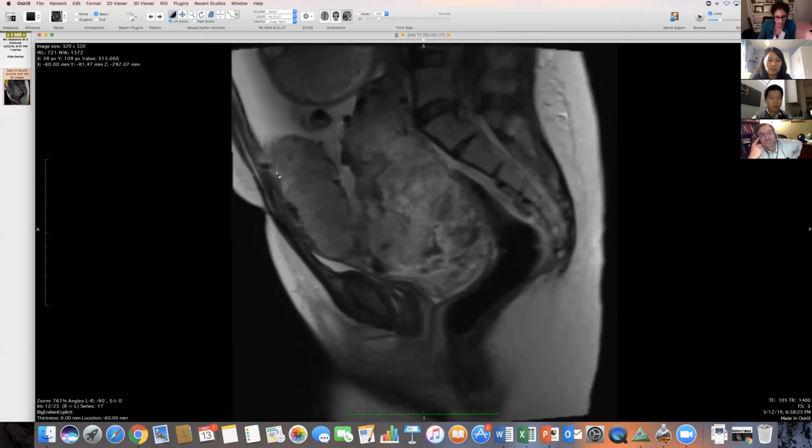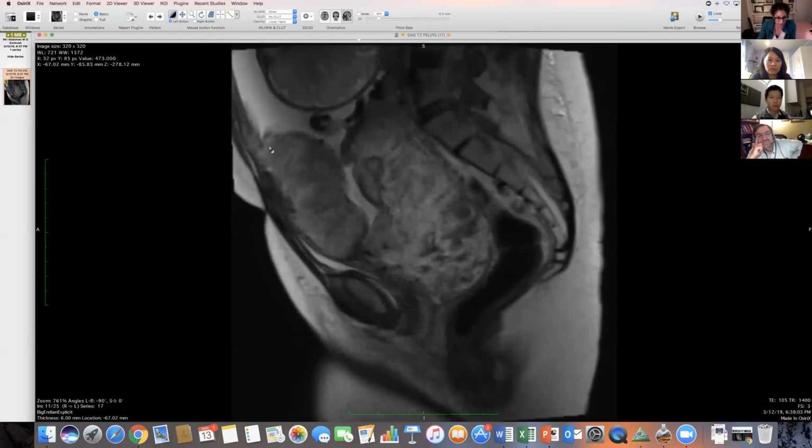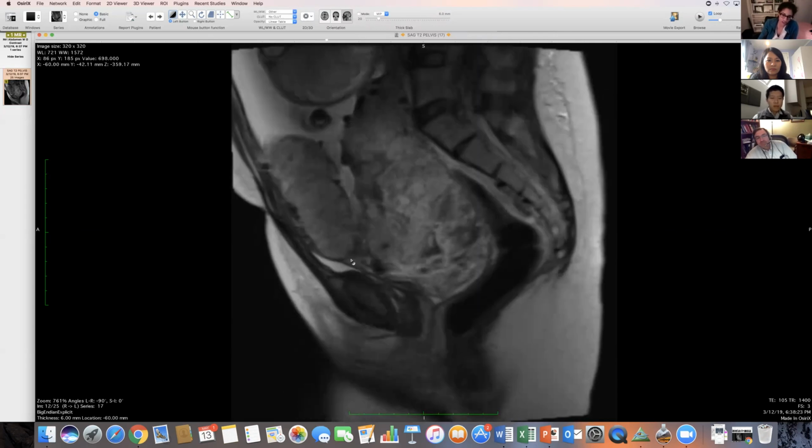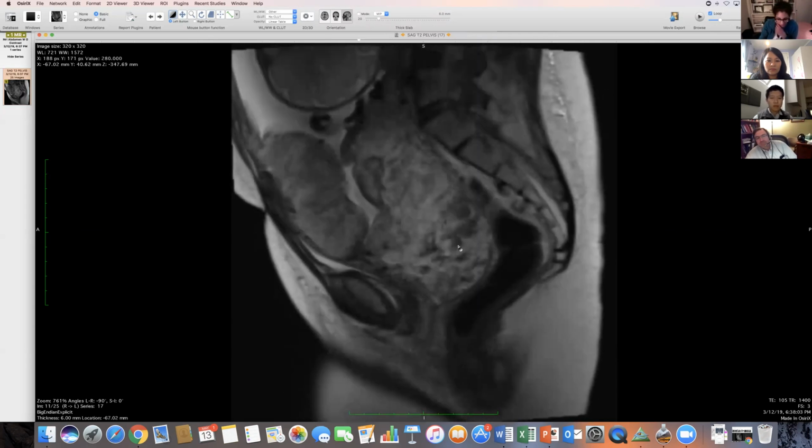So we were concerned also that there could be basically some spectrum of a placental invasion into the very thin myometrium here. I find it's really, really hard to tell. Like, is it accreta, increta? The most obvious is percreta, where it's going all the way through and invading another organ. We were looking carefully at the bladder here. Another sign of any of those things is heterogeneity of the placenta, and then T2 hypointense bands.